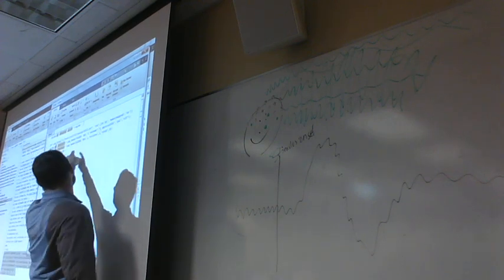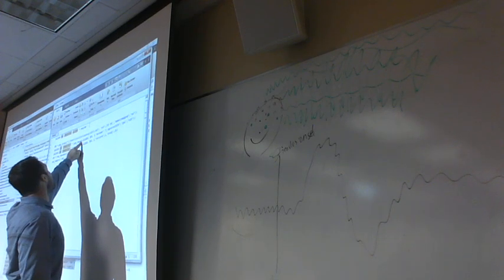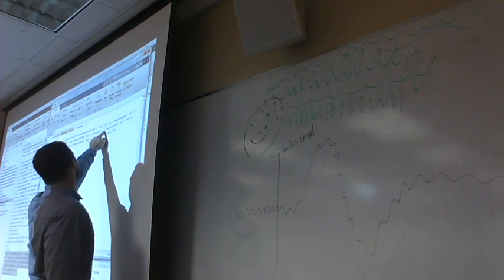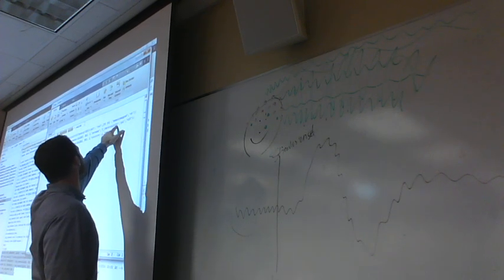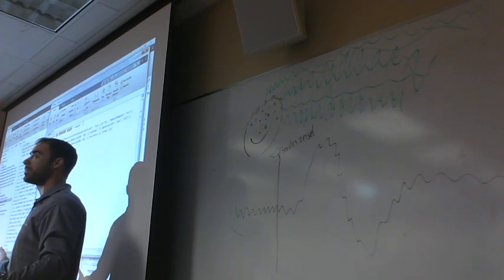And we said yes, and we gave it a name. So it's a new data set. It's EEG, and we named it 3_imported 3334. Make sense? Method to the madness.